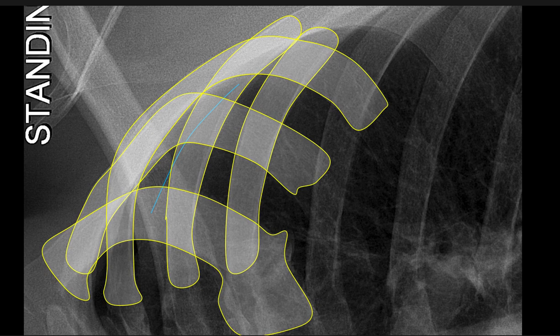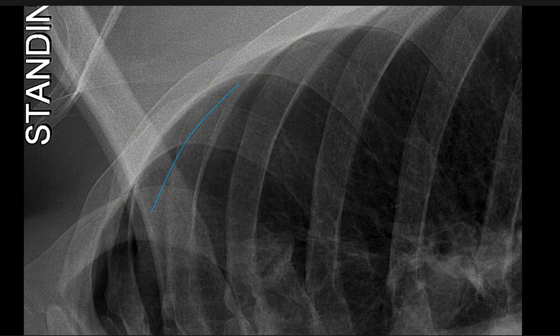And once you've explained every line, if you've got this blue one left over that has to be explained, then you have to be like, well, it's not a companion shadow, it's not a rib, and it's not artifact, we're pretty sure, based on the morphology. Again, we'll talk about how to tell artifact from an actual pleural line in just a minute or two. Then you have to call it. So that's the last strategy that I use there.